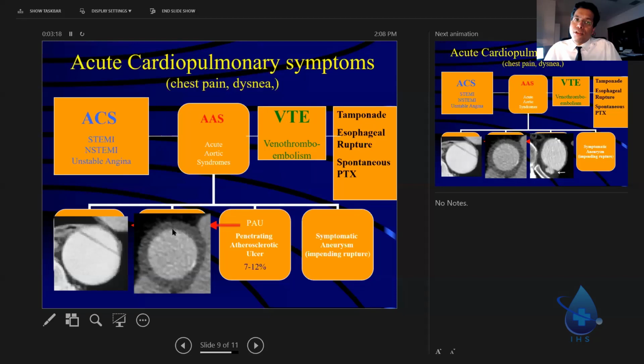I mean, if this is only partially circumferential, and 6 or 12 hours later it becomes completely circumferential, then it's not atheroma, because atherosclerosis doesn't happen that fast. If it's only 40 millimeters in the superior to inferior axis, and it evolves in 24 hours on the CT scan to now encompass 60 or 70 millimeters, superiorly up the aorta or inferiorly down the aorta, then you know it's an acute aortic syndrome. It's not atheroma. So that is a logical way to sort out an acute aortic syndrome from atheroma.